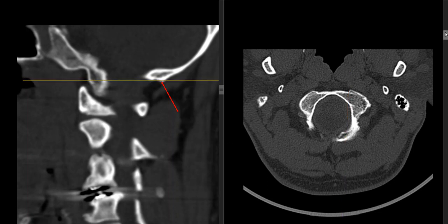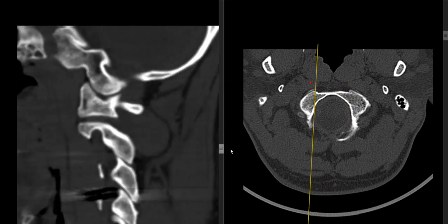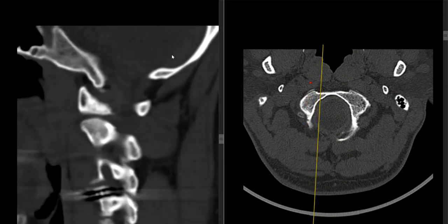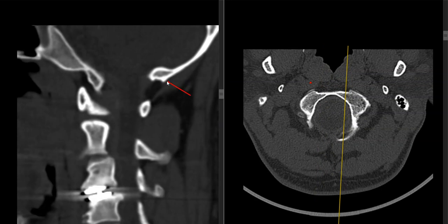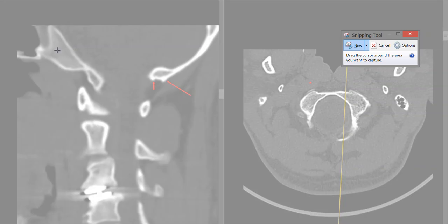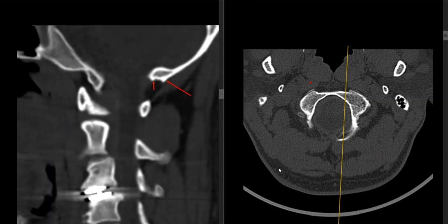So obviously it's a white signal, but I can't judge that. Obviously it's just judged on this sagittal view. And because of symmetry, you don't see it on this side. You see a little bit right there, but not as significant as this. So let me arrow this one and arrow that one. All right, so that's the PAOM. I can spell with my mouse.